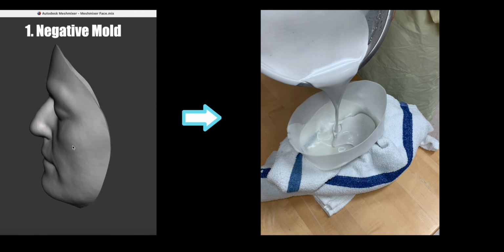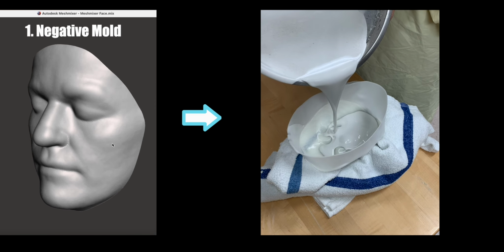In part 2, I'll explain 3 techniques of how to create a negative mold if you want a pore plaster, create a positive mold for pulling an orthosis, and finally a method to directly print the mask itself. But in this video, I'll be showing the basics of Meshmixer and the steps to prepare the model.